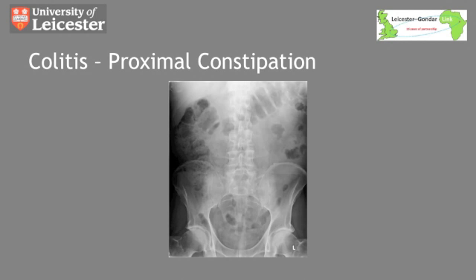In this x-ray you can see a dappled or pixelated appearance in the ascending colon on the patient's right. It's unusual to see solid stool in this area, as the colon works to turn liquid stool from the small bowel into formed stool by the time it reaches the rectum. This patient has left-sided colitis, and this can result in disturbance to gut motility, which leads to proximal constipation. In patients with left-sided colitis, the inflammation in the left colon will not improve until this proximal constipation is cleared with laxative therapy.